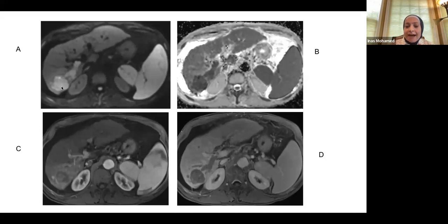The fact that you have a tumor thrombus in the portal vein would make you say, oh no, it's not cholangiocarcinoma. It doesn't do that. And we have certain neoplasms in the abdomen that actually love going to the vein. Like, let's say you have this infiltrating lesion in the kidney. Is this infiltrating renal cell carcinoma or is it urothelial carcinoma? If it's going to the renal vein and the IVC, most likely this is going to be RCC, infiltrating RCC.